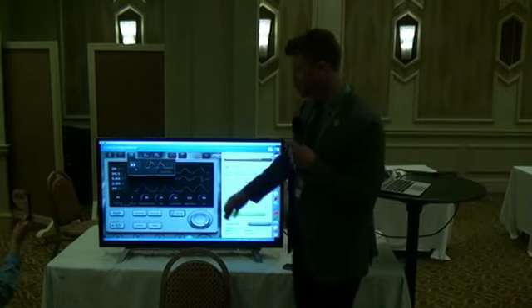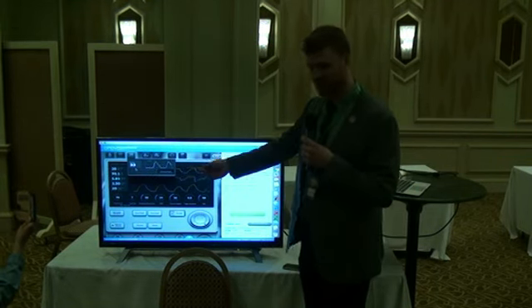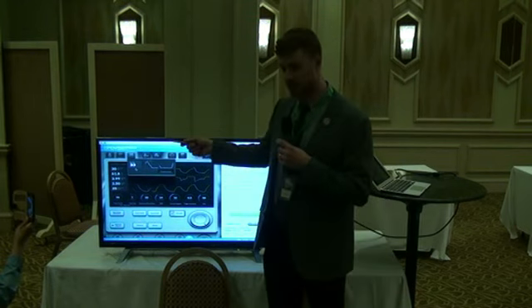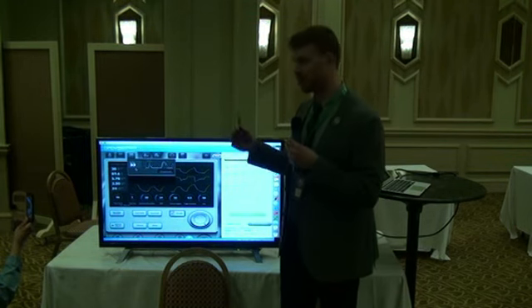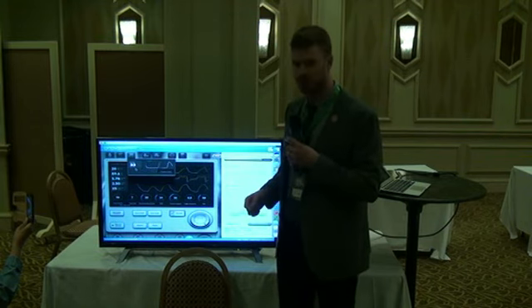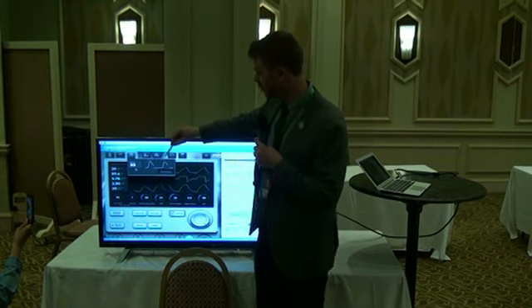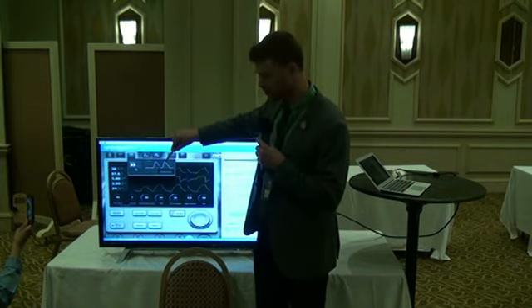All right, good or bad, or we don't know? Yeah, definitely not right. Something's not right. So I didn't show you this one. If you remember all the things that I showed you during the lecture, the answer is not one of those. But it looks really similar to cardiopulmonary interactions because we have kind of a decay right at the end of the capnogram. How about the beginning of the breath? Does the beginning look okay or bad?